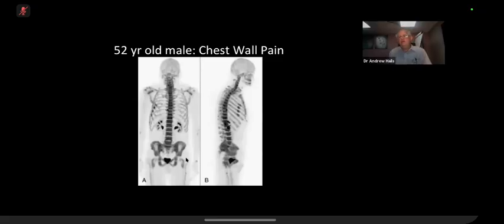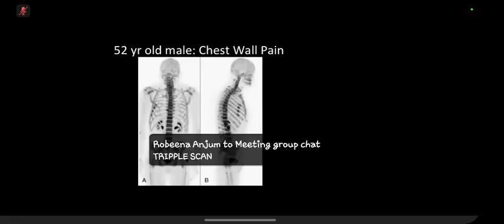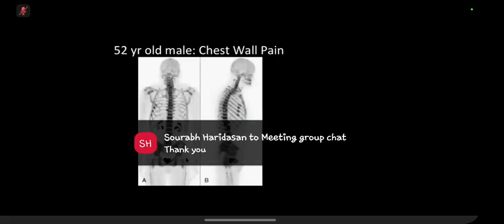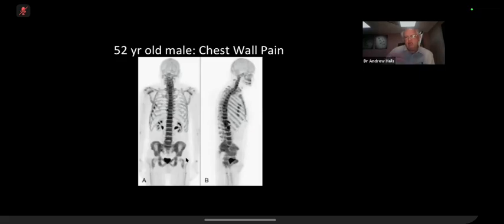Okay, so why has this person got chest pain? If they had that substantial trauma, I would think that it would be more like a flail chest, and you would probably have another segment of it. It looks almost like it's at the end of the rib. So whether they've got a costochondritis, or is it not far enough anterior? I think probably not far enough anterior, but more particularly, if you get uptake in contiguous ribs like that, it really is always due to trauma.